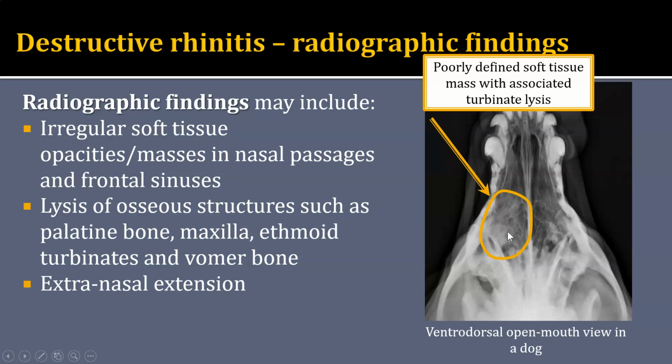There are also some other areas of lysis that's a little bit more moth-eaten here as well. Remember that we were using that margin of this kind of sclerotic line to stay away from the soft tissue rostral nasal turbinates in demarcating them from our larger osseous structures.